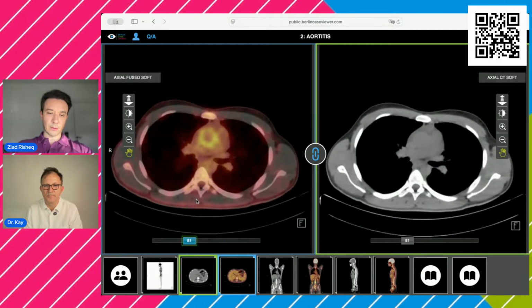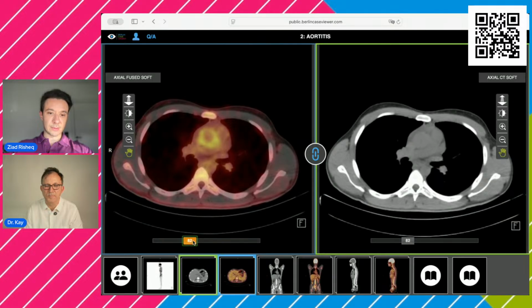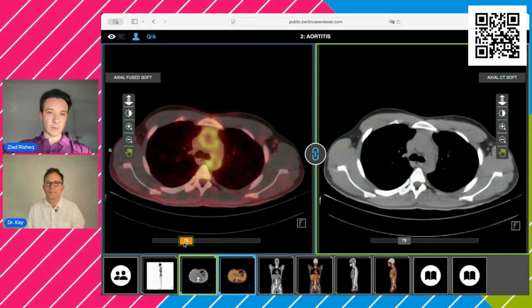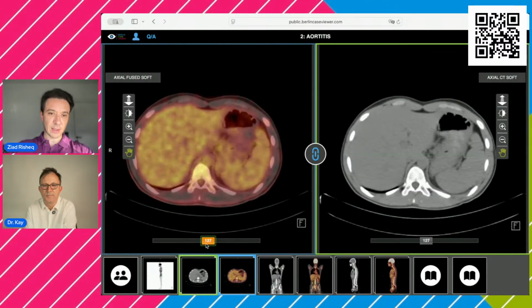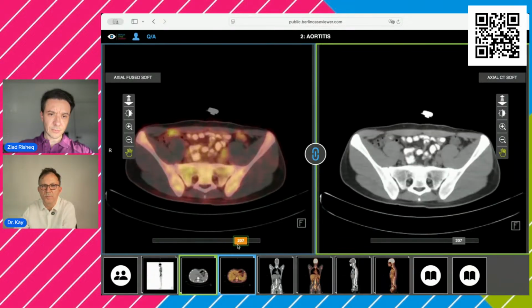So you have to look at other organs, especially the lungs. We look for nodules in the lung, especially cavitary nodules. If it's rheumatoid arthritis, usually we see them in the basal segments or in the lower lobes, and sometimes they can show intense uptake, but usually they don't show significant uptake. And the abdominal aorta was fine.